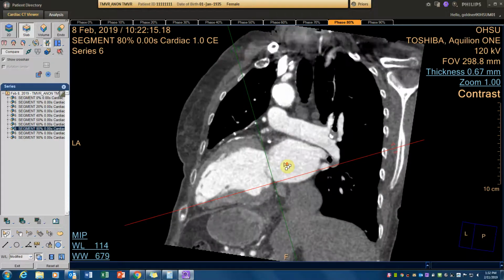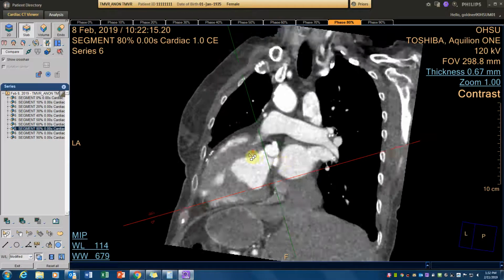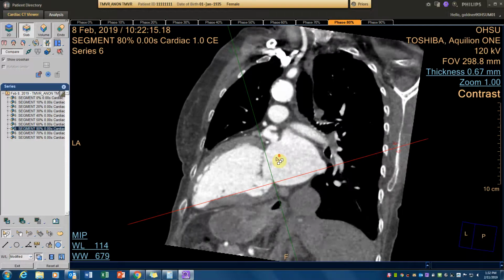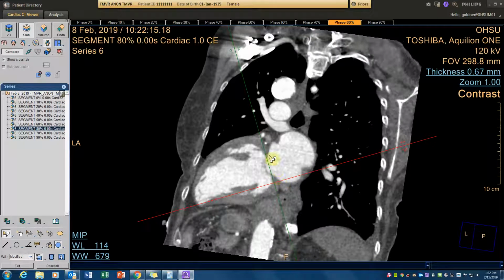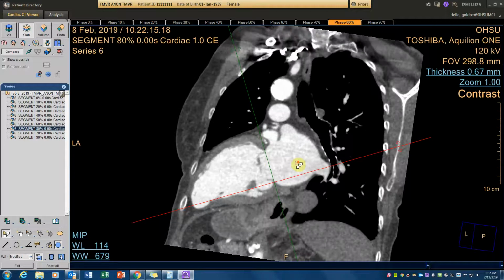And go back and forth a couple different slices. See how the anterior part is kind of diving out? That's because, as you know, there's fibrous continuity between the LVOT and the left ventricle inflow tract. So just scroll around, make sure that this cursor is kind of over the area that we want it to be the whole time. Here it looks like maybe I'll move it a little bit, but otherwise pretty good.